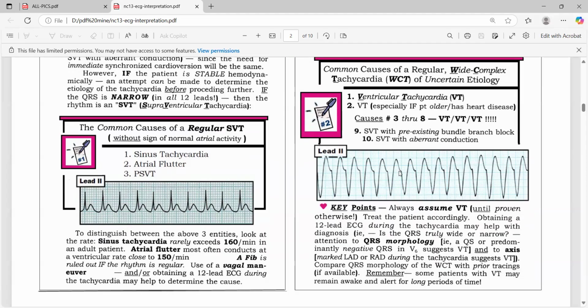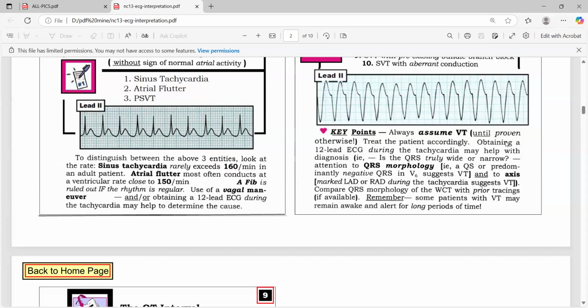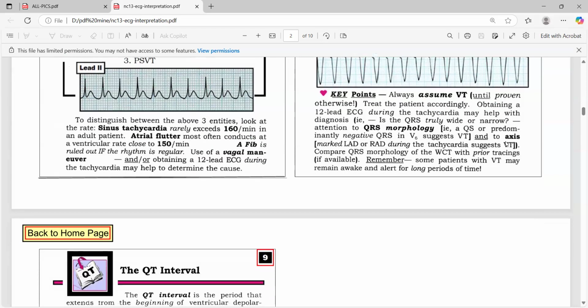So please, wherever you are checking for the rhythm, if you are checking for lead 2, mainly for your understanding, if they give you an ECG, usually the second lead is the one that is very elaborative. So rate and rhythm, this one helps from lead 2. Okay, so if you are confused about anywhere else, go to lead 2 and check from there whether the rhythm is regular and what the rate is.